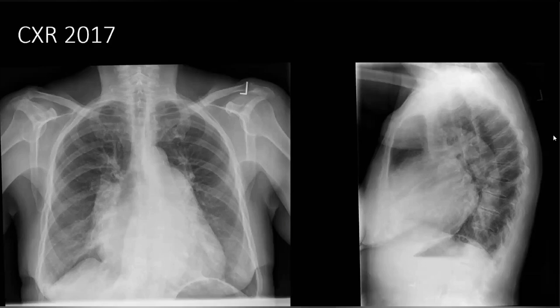Why are you basing your diagnosis as sarcoidosis? What are the supportive findings? Because of the bilateral symmetrical hilar lymphadenopathy, female patient and middle-aged, that's why. Isn't sarcoid more common in males? No, sarcoid is slightly more common in females, as far as I know.